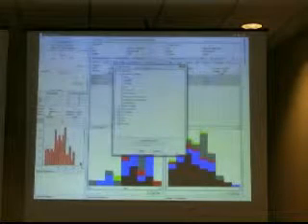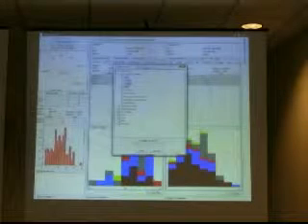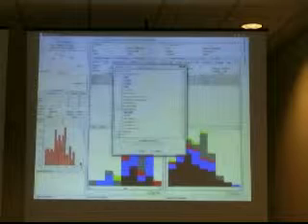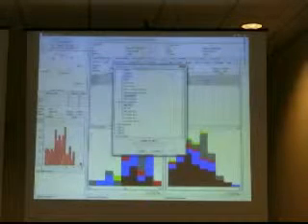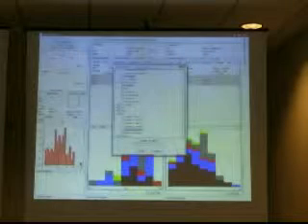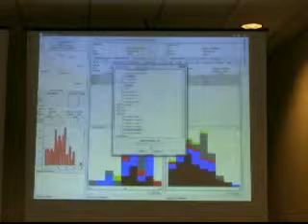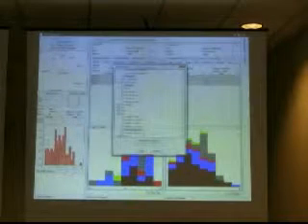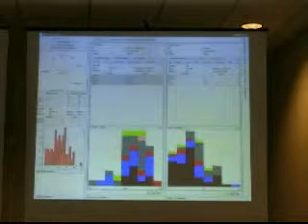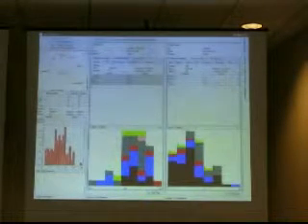Let's say heart rate, elements of MR imaging, and then the maximum number of patients you want to get from the system for that particular cardiac study. Again, the interface interacts with the system. It measures similarity distances between the different patients and then renders graphically the result using 3 different visualization techniques.